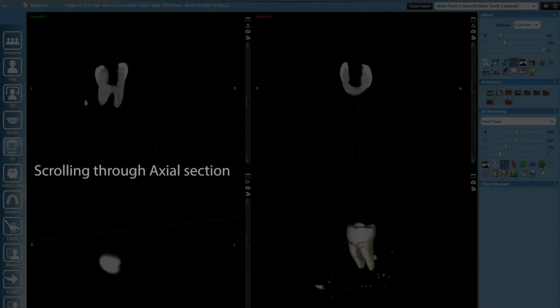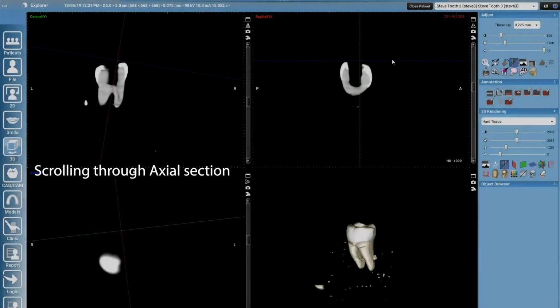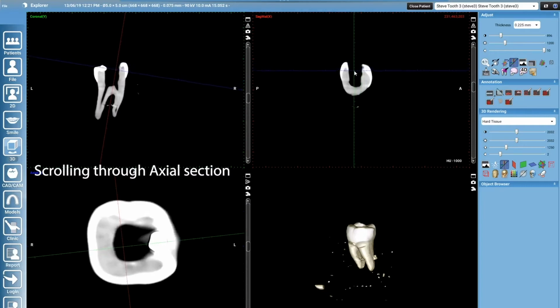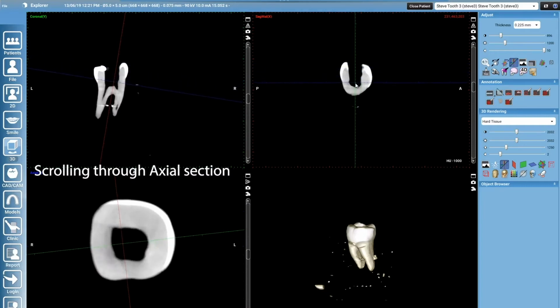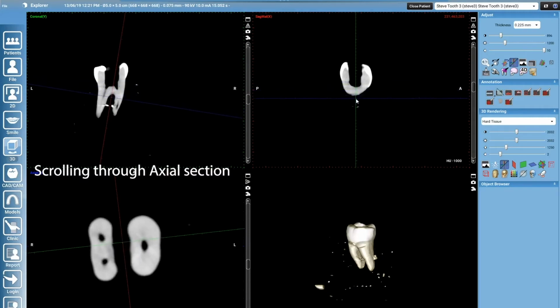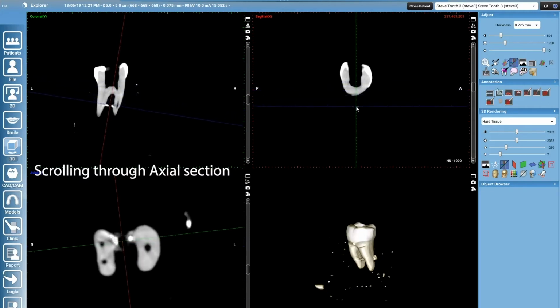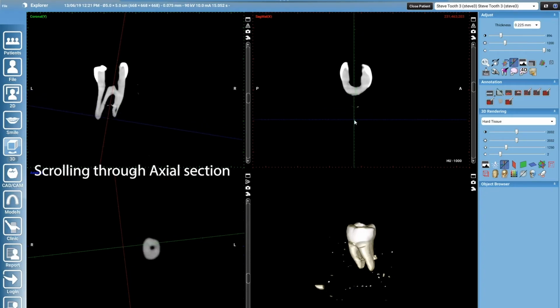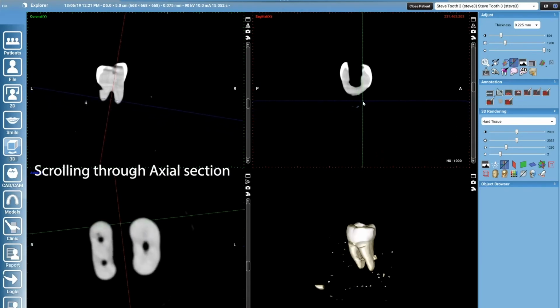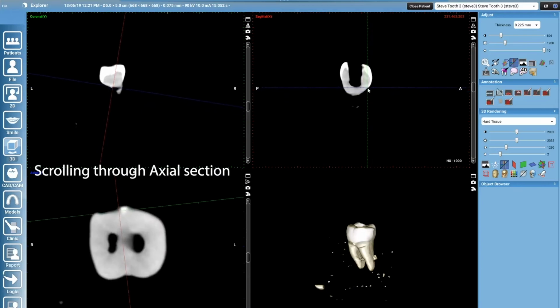And just coming back through the axial system, make sure you don't leave on your model big chunks of amalgam when you do a CBCT, otherwise you do get these flashes. You can see them in the lower section here. I apologize for not cleaning the model there. And then scrolling back up, just look at the centered nature of these preps. Really beautiful in these very curved canal systems.